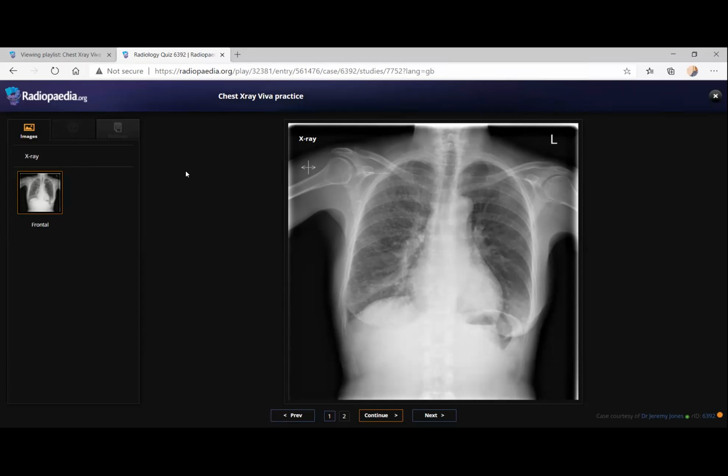In view of the presence of the surgical clips, I would think about lymphangitis carcinomatosa secondary to a previous history of breast cancer. I would refer this patient further to the MDT team, and I would ask for a CT of the chest, abdomen, and the pelvis for further assessment. Patient is already on MDT and already had a CT abdomen chest. Okay. So you just have to compare with the previous one. Okay. Yes. Okay.